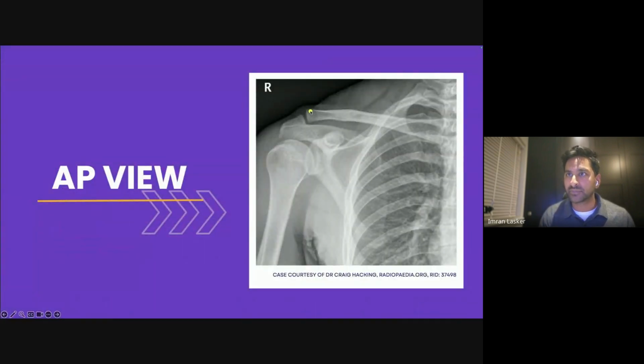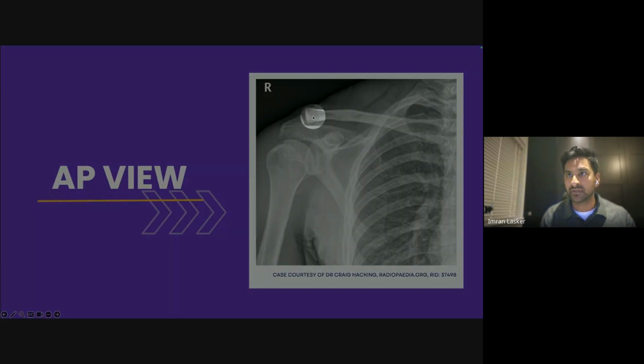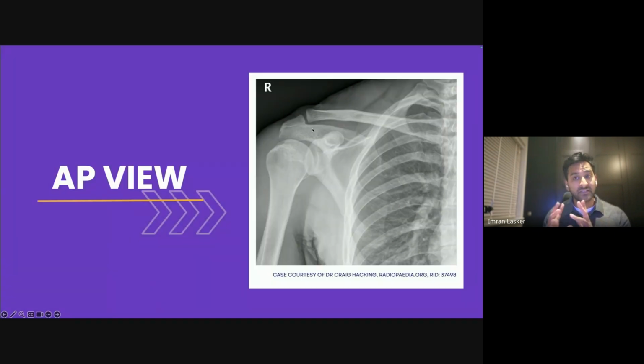When you look at the edges of the bones, it becomes very sclerotic as you get to the edge. And sclerotic means it gets very white in appearance. So look at the bone, and as you look at the central area, it looks sort of blackish, and as you get to the edges, it looks very white, and gets whiter and whiter at the edges. And that's kind of normal structure.